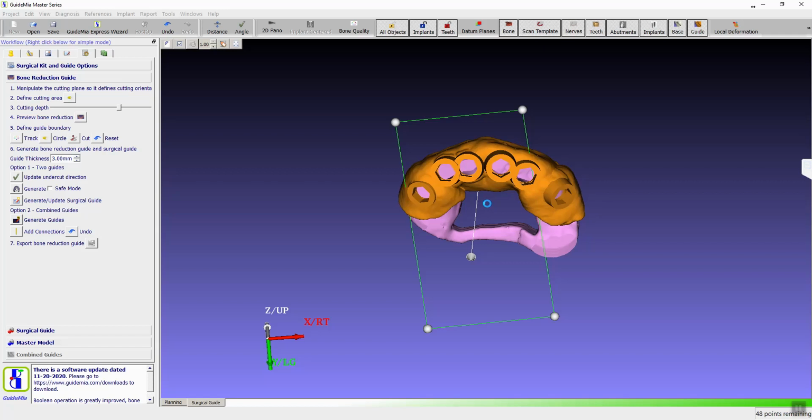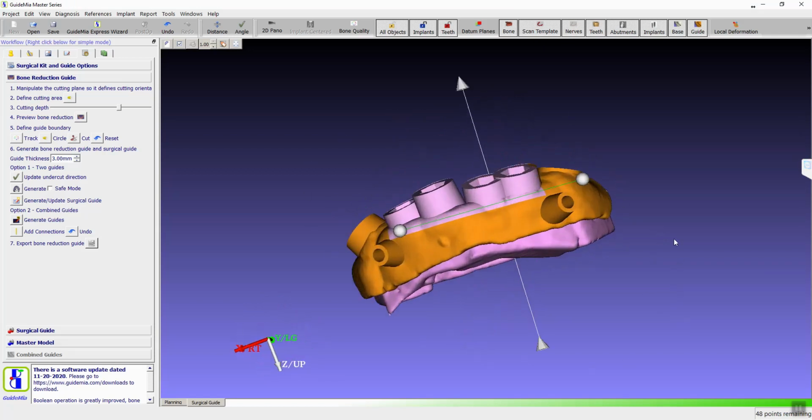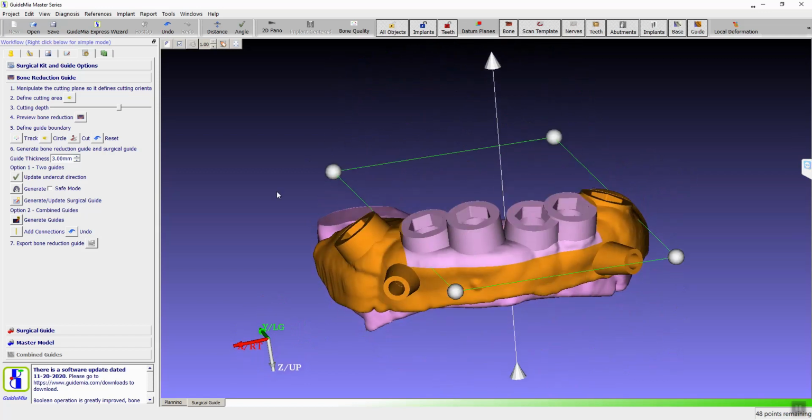So we have the orange, the base for the guide, and then we're going to cut this into 2 pieces. After our guide pin shows up. Yep. The pin is always a little challenging in bone reduction situations, actually. Yeah, no, we got that. So did it propose a second guide on the top there? Yes, this is a second guide. So you got 2 guides here, different color. So this one piece, this another piece.